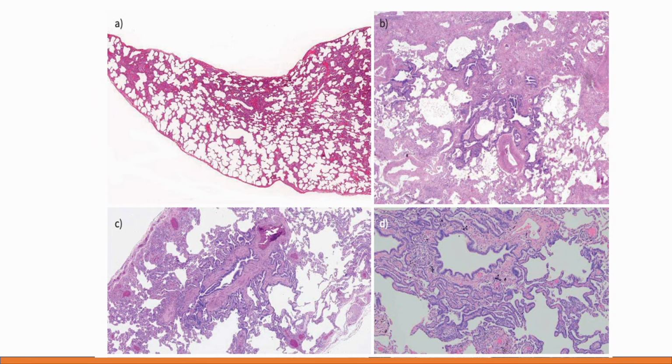When you come to the pathology, now H&E stain of non-fibrotic BIP and fibrotic BIP. So in the histopathology of non-fibrotic BIP, you would see granulomatous and lymphoplasmacytic inflammation, which will happen within the bronchial walls. And this inflammation will then extend into the alveolar walls from the bronchial walls. So it will be bronchiolocentric. The inflammation will be seen within the bronchial walls and extend into the adjacent alveolar space. That would be BIP, for example, secondary to HP.